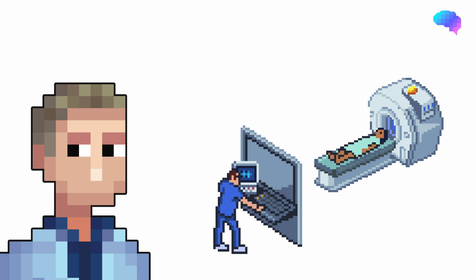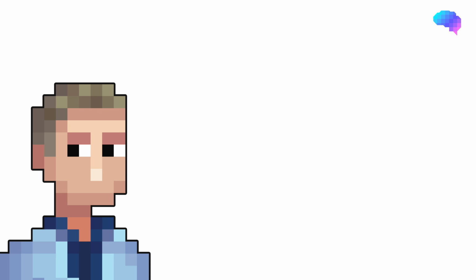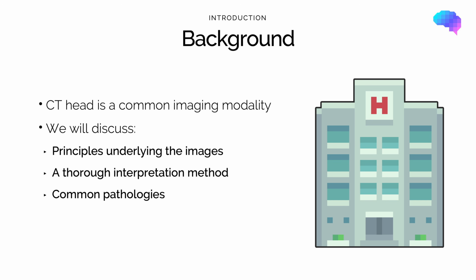So I know for some of you guys this will be your first introduction to CT heads, whereas for others it will just be a refresher session. In either case, we're just going to go through CT heads from the very beginning, starting with the underlying principles and finishing up with a nice way to interpret the images, whether it be in an exam or on the wards. So CT head scans are a very common imaging modality.